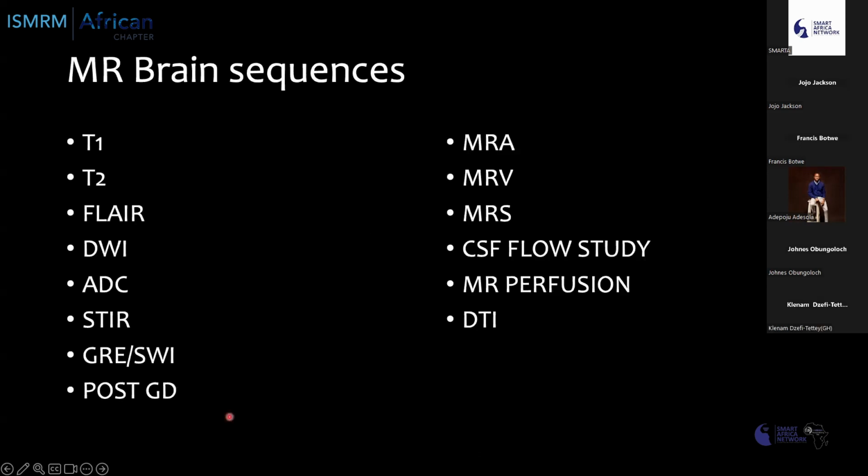Hello. So let's look at some important brain sequences.